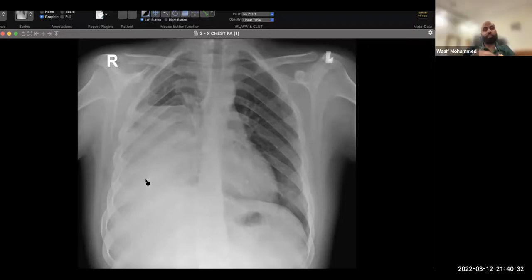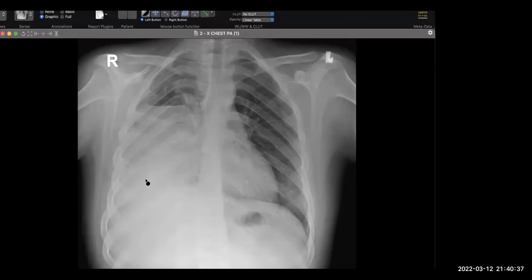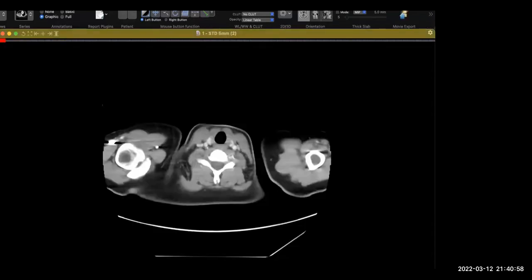The patient does have fever, which is long-standing. So if it's a long-standing fever, this could be loculated pleural effusion or empyema. So I think the patient would require further assessment with CT thorax with contrast to further evaluate the right-sided area as well as the effusion. Okay.